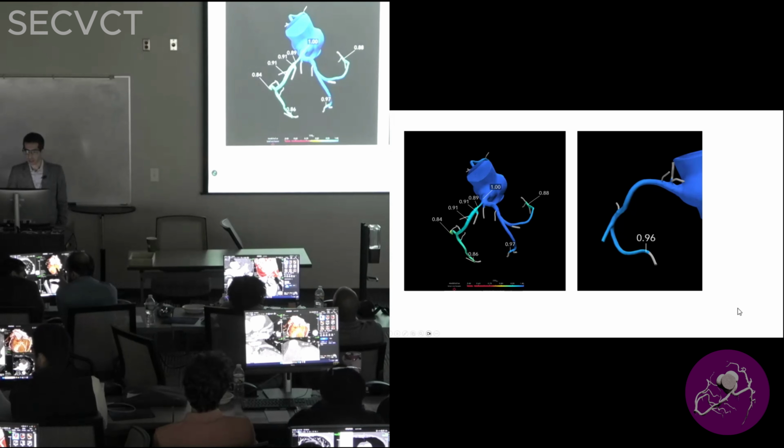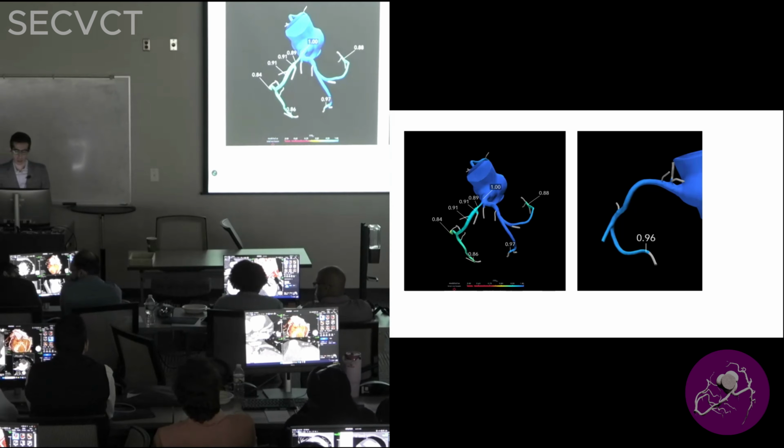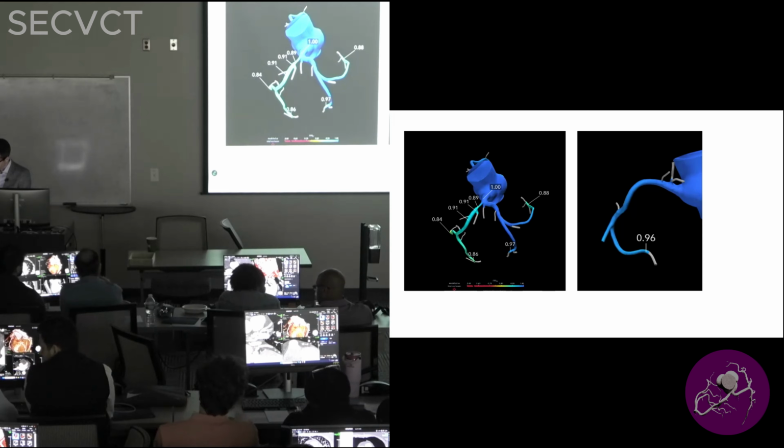that this patient can benefit from one risk factor, like for anti-lipid management and so on. So this is a case, I think, just to point out again, the CT-FFR is not always, as I would say, immune to the measurement errors that can be encountered. Any question about this case before I show another case quickly, if we have time?